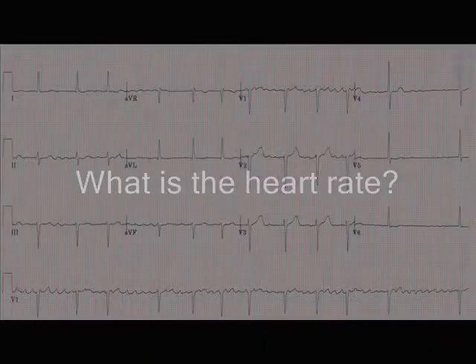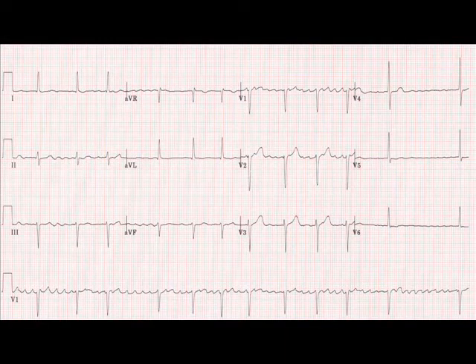If it's irregular, count 30 large squares and the number of R waves within that 30 large square period, and times that by 10. It just picks up a little more of the irregularity. But really it's best to take the patient's pulse for a full minute, and as I said before, you'll gain a lot more by feeling the pulse, character, strength of pulse and so forth.